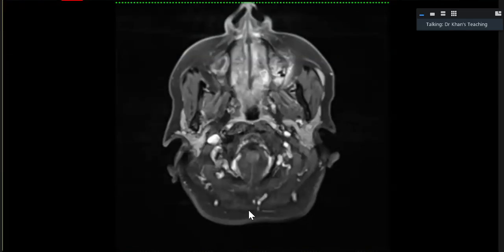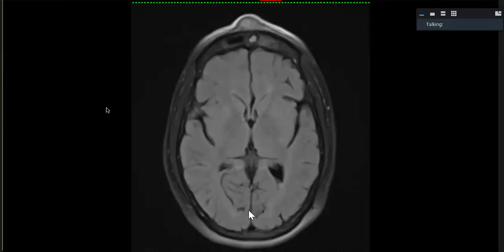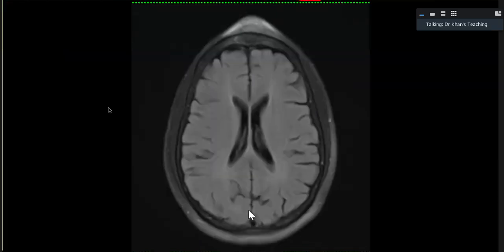That's fine. So this is basically an interesting case, and this is hot off the press. I reported it 3 days ago, actually. Now, the patient had banged the forehead, and there was a hematoma, and then presented back with this 68-year-old. Now, the candidate did well, except for 2 points, which I will point out as we go through it.